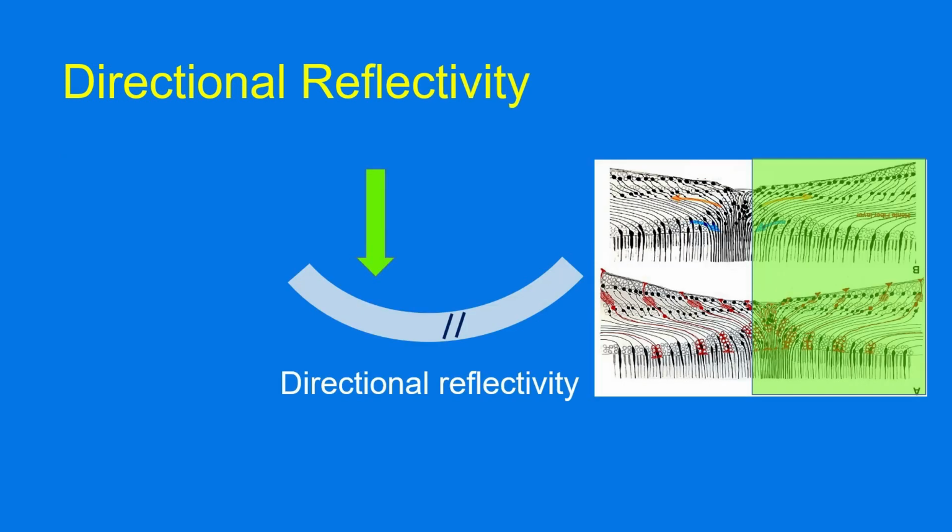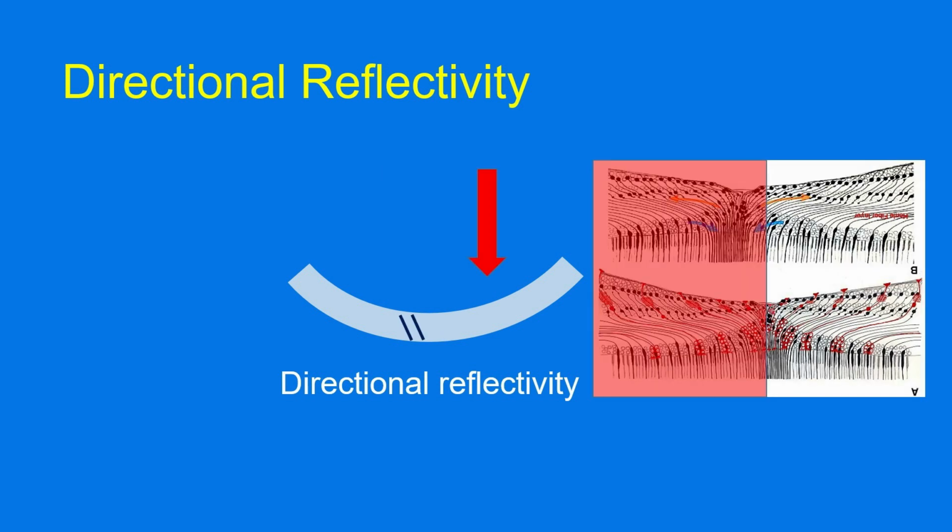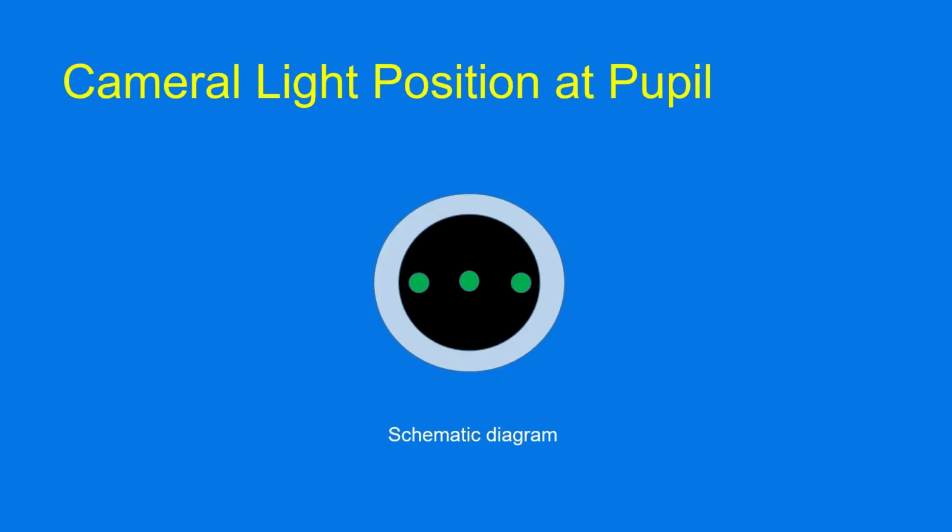If we see this green light which is falling on the left corner, it is more perpendicular towards the other side, and it will image the other side or the side highlighted on the schematic diagram of the macula. Red light falling here will be more perpendicular to the area of the retina highlighted in the schematic diagram. So consider the practical scenario.